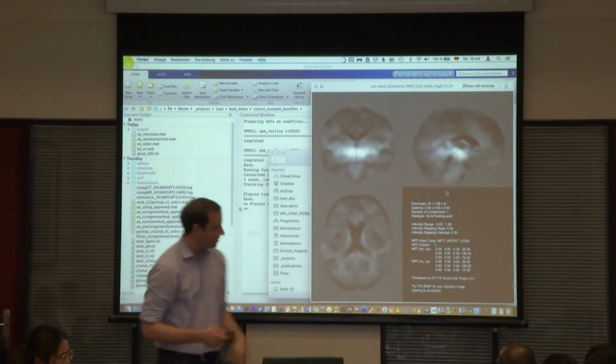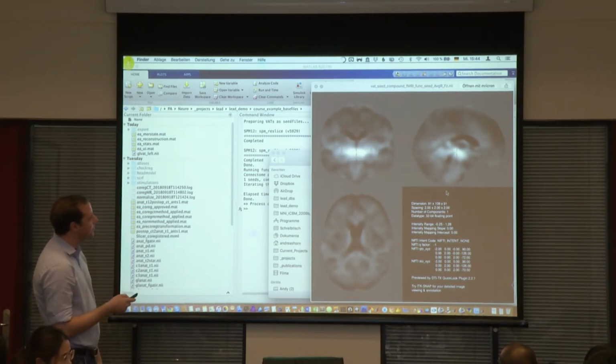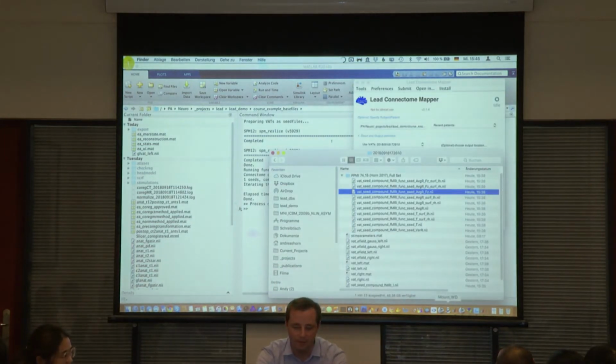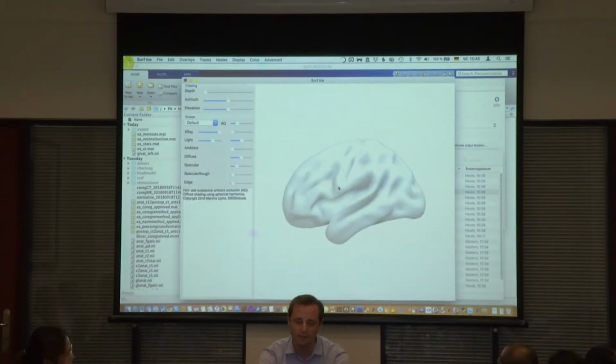And that is the connectivity map, so it's seeded functional connectivity across 74 PPMI patients, and gives you estimates of how much functional connectivity you have to other brain regions. And you could use that file, for example, in the great software Surfice that we use a lot.